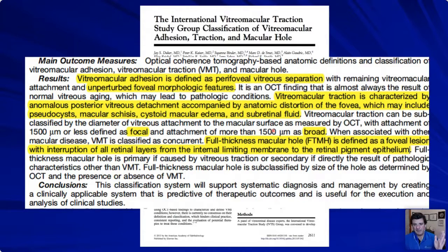So in these wide field scans, you can capture the optic nerve and you'll learn what 1,500 microns is. Remember that just outside the fovea they're about 340 microns, 260 microns at the foveal pit. You can use that and measure.